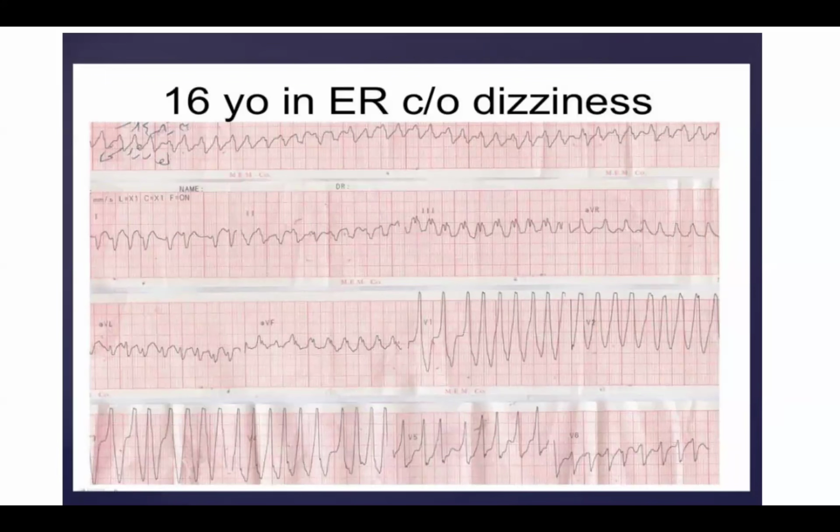If you cardioverted, would you synchronize to the A or the V? You would be doing synchronized cardioversion, so I'd synchronize to the V. Right, because you don't want to put an R on T when you're defibrillating the patient, or well, you would be defibrillating them, right, because you're trying to terminate atrial fibrillation here. So this is rapidly conducted AFib.